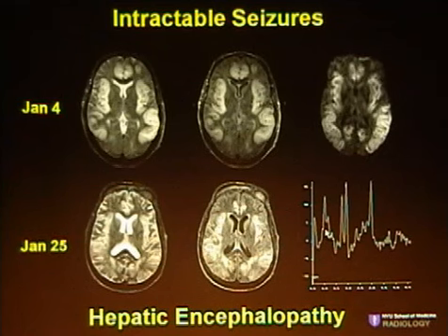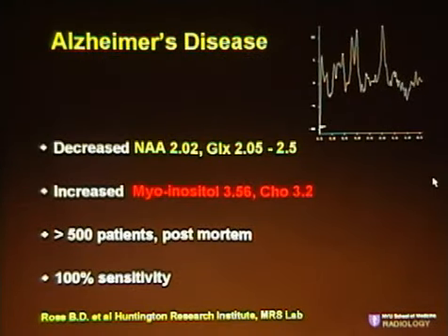A lot of myo-inositol is excreted by the kidneys, so the myo-inositol is reduced. So even though the MR looks very bizarre looking, the spectrum is fairly good for hepatic encephalopathy. You sometimes see this spectrum also in a uremic encephalopathy. And that patient incidentally had gallstones and was also an alcoholic and ended up with those findings.